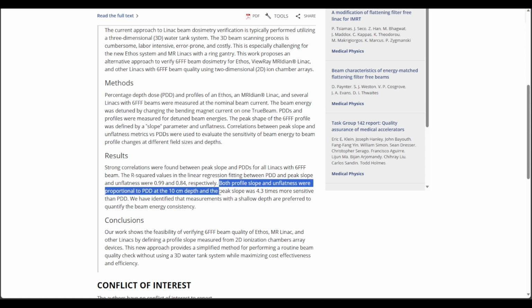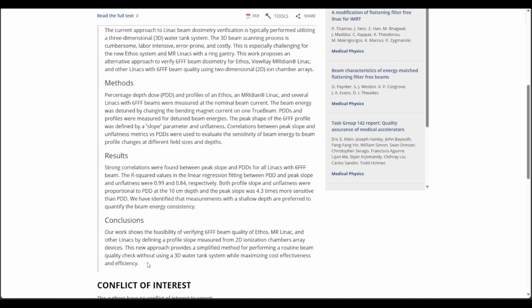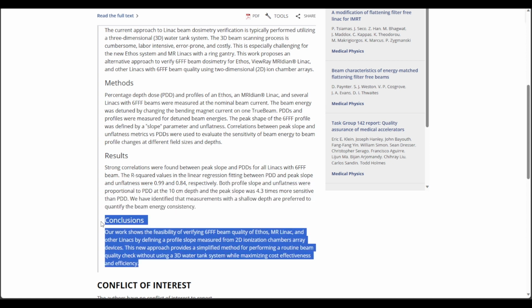Here we go. We used Simac to do an experiment, and replicated the procedure and results proposed in the paper. Also, we just did 6 beam and water tank scans, all from the comfort of our laptop and faster than the time it takes to treat a patient.